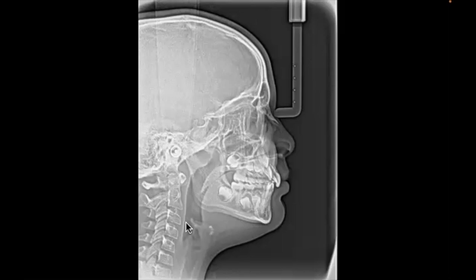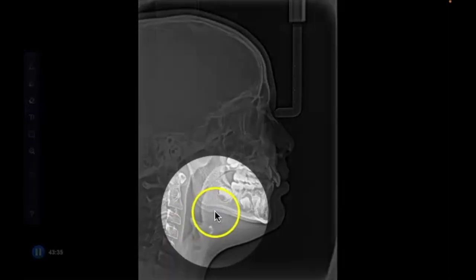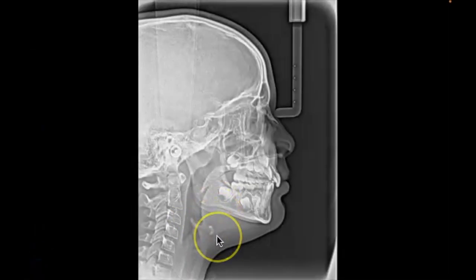But, and this is something we haven't talked about today or maybe ever with you guys yet, look at the Ceph. What are you seeing that's a little unusual? Okay, yeah, again, it could just be that the head is tilted, right? And probably that's what it is. But let's say the head wasn't tilted. What's telling you that? The lower corners of the mandible don't match up. All right, awesome. We have our golden ticket answer for the day. Pass that back to her.